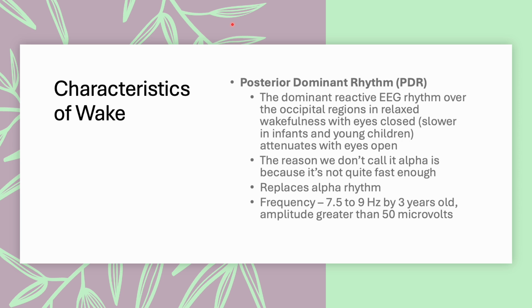So we'll see these things. They're uncommon in children younger than 2 years of age. We see them the most between 8 and 14 years old, and they're uncommon after 21 years old. I'll show you a slide of those in just a second. Random or semi-rhythmic occipital slowing, less than 100 microvolts, 2.5 to 4.5 hertz rhythmic or arrhythmic activity.